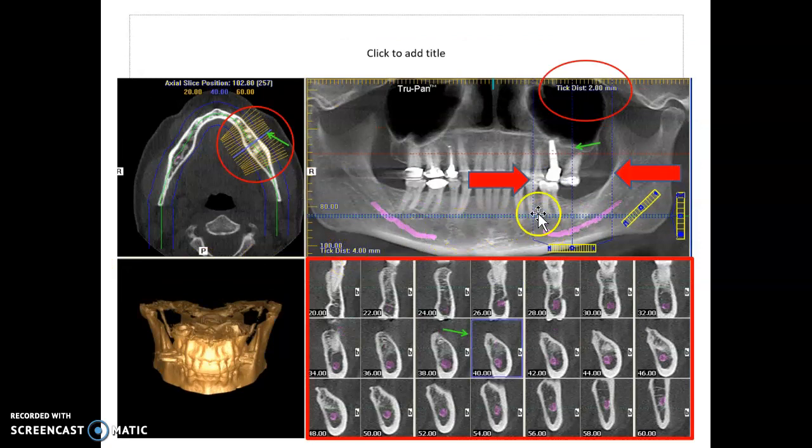Here you've got a blue line that is the edge, and then another blue line that is your other edge. Each of these little yellow lines, as you go across this little ruler, is represented here. If you were looking at this image, each of these yellow lines is a slice. So you can look at it as the traditional panoramic and see those little slices, but they've made one big image of it.